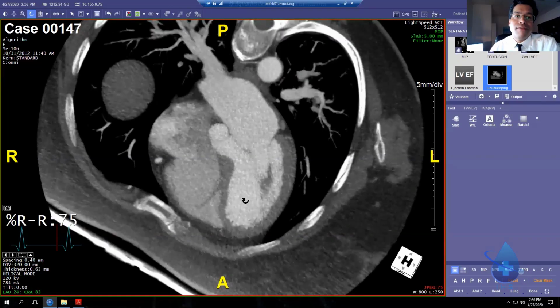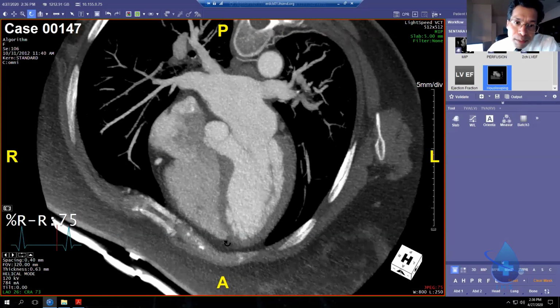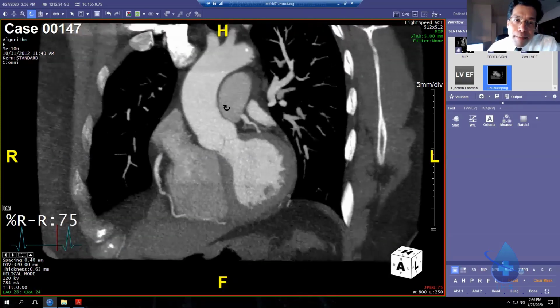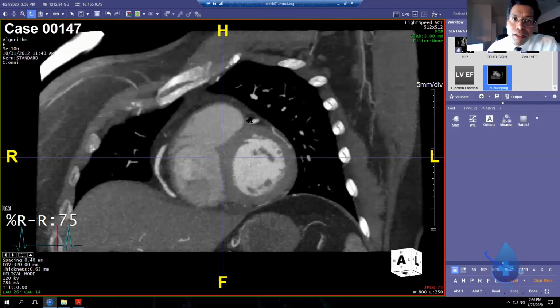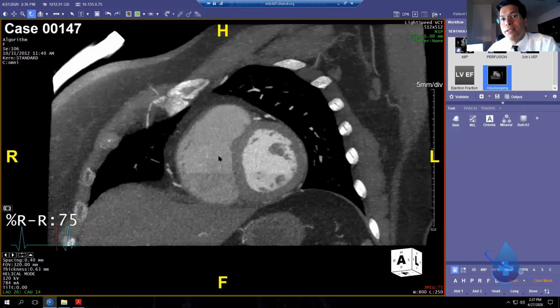Well, it looks like the RV is larger, but I said larger volume, right? I'm confusing you. Okay. The RV in the 4-chamber view should never look larger than the LV. In the 4-chamber view, that is a truism, and that is what our echocardiographers teach us. But if you take the same patient and simply left click into a short axis view, now tell me which is the larger volume. Okay, the larger chamber now looks like to be the RV instead of LV.